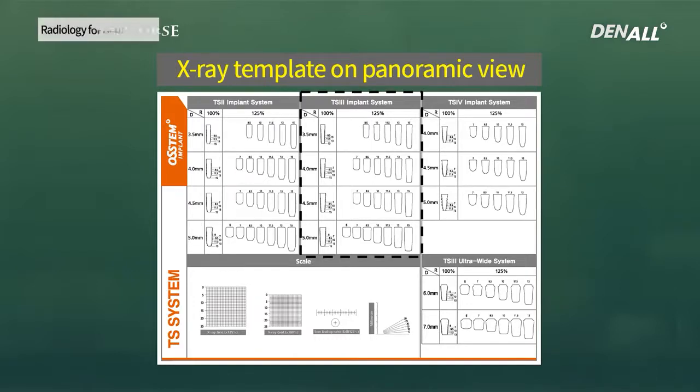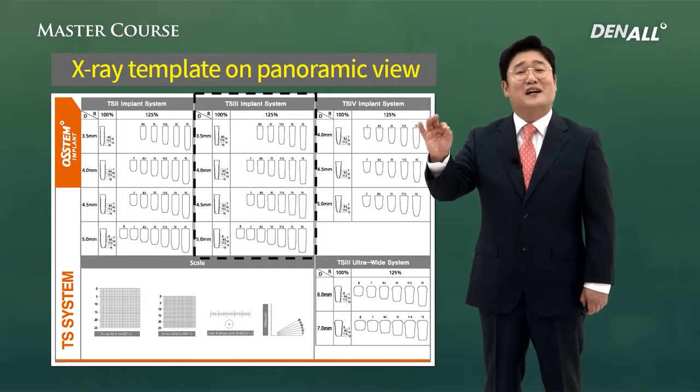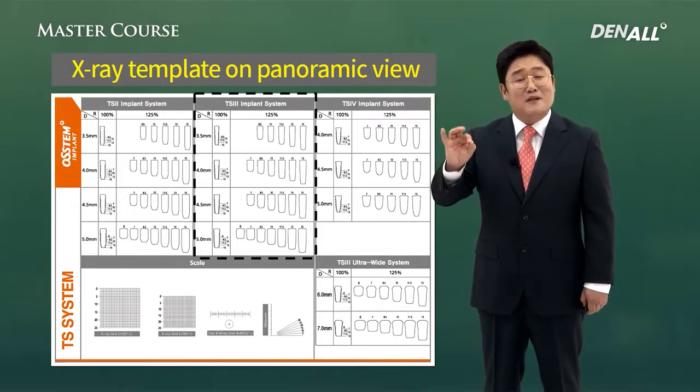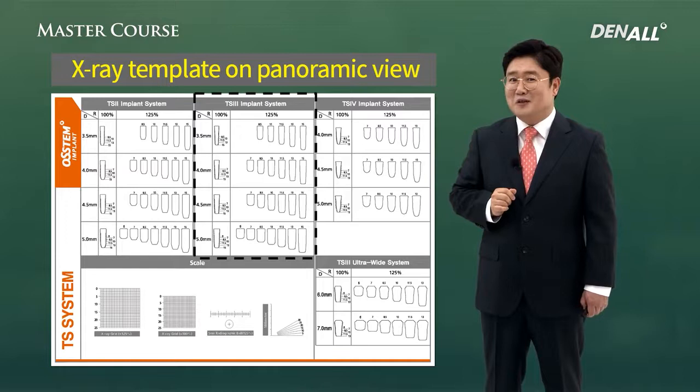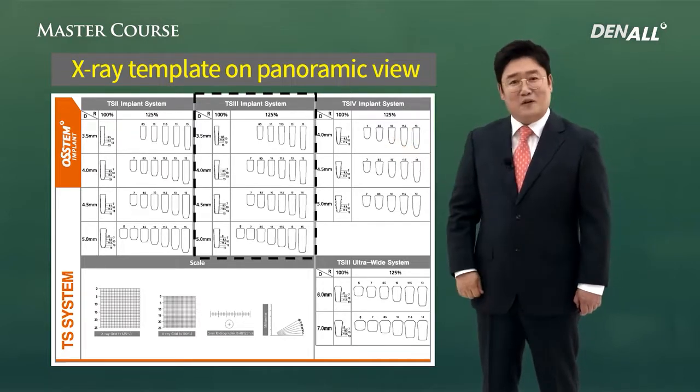The defective region's bone height can be measured, as I said. They are not measured just with a ruler. X-ray template is used for that purpose. In Korea, digital trend is very strong today, so bone height can be measured with the program, but still in many other countries, X-ray template is in use.